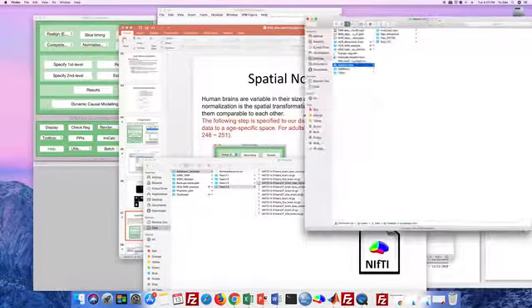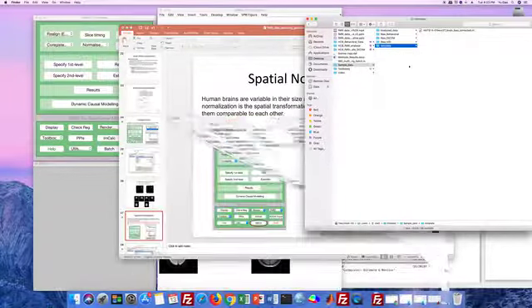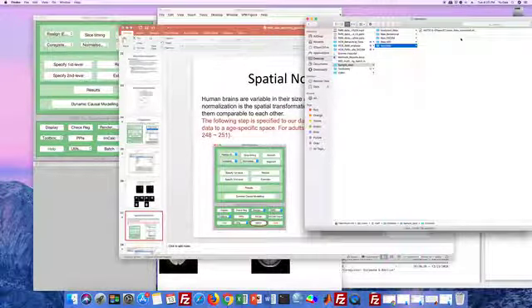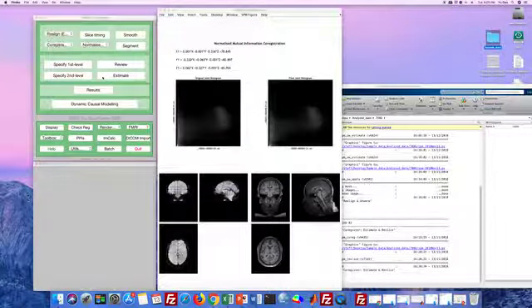Okay, so now for the sample data, I created a folder called template. Here I have one image called the ANTS 14 years old 3T brain bias corrected. This is from another public data set. If you want to know where it comes from, check our paper for this project.